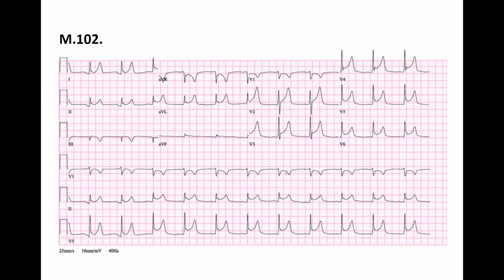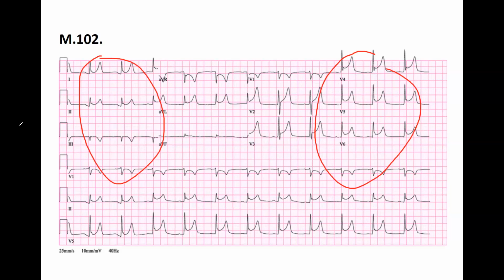Now, if I check the ST segment, first of all, you can check the size of the R wave. This is a little introduction to the hypertrophies. You know that in the chest leads it should not be bigger than 25 millimeters, or in the limb leads, it should not be bigger than 10 millimeters. All right. Now, you do not see any big R wave in V1, so there's no sign of ventricular hypertrophy.